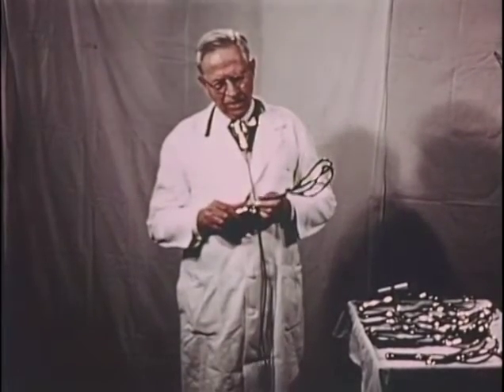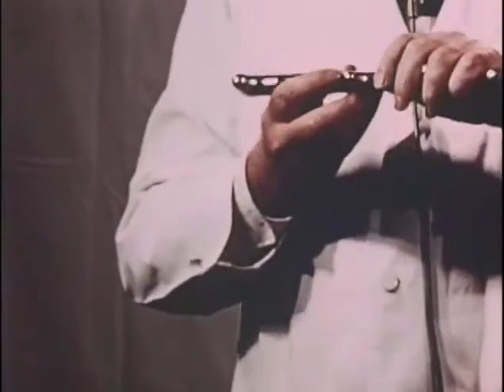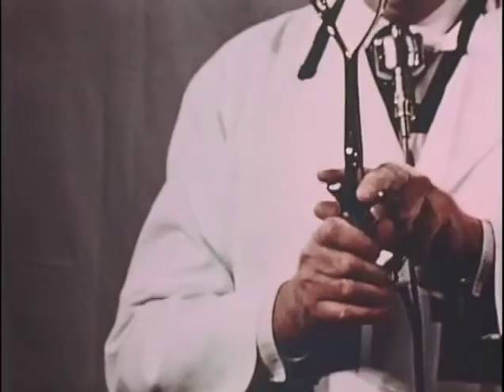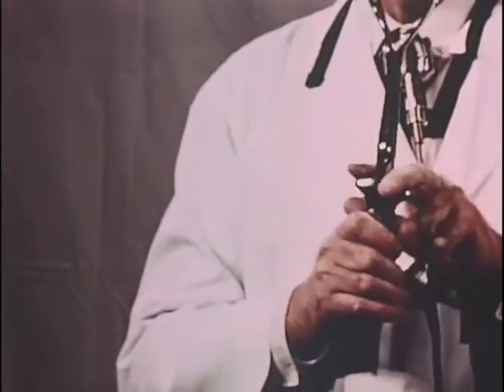The object of the fixed lock was thought to be to prevent slipping of the forceps from the fetal head. However, nowadays it's felt if one has chosen the proper instrument and applied it properly, there would be no necessity for a fixed lock. At the junction of the handles with the shanks are projections known as the finger guards.